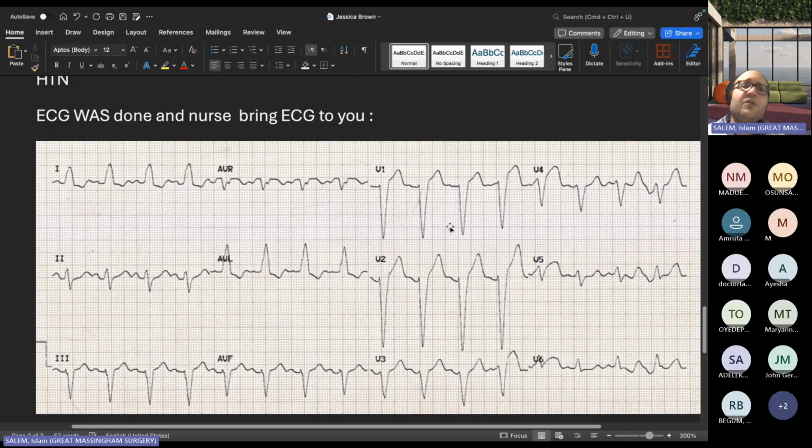The Smith modification, or the excessive discordance. Sometimes there will be something called excessive discordance. In all of them, the QRS complex is against the ST direction. You can see in all leads the QRS complex is in the opposite direction. So is this excessive or not? Excessive discordance means there is a proportion between the depth of the vector of the QRS and the amount of elevation.